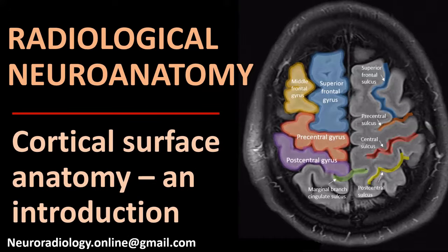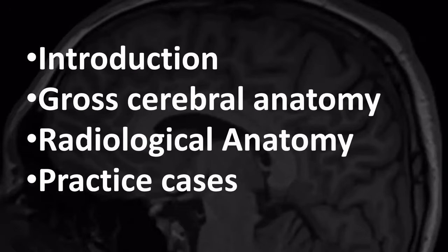And you are now watching a video on cortical surface anatomy, more specifically on how to recognize the various cerebral gyri and sulci on cross-sectional imaging studies of the brain. In this presentation, I'm going to start with a short introduction. Then we're going to talk about gross cerebral anatomy and translate that anatomical knowledge to radiological imaging studies. We're going to finish with some practice cases to see if we actually learned anything new.